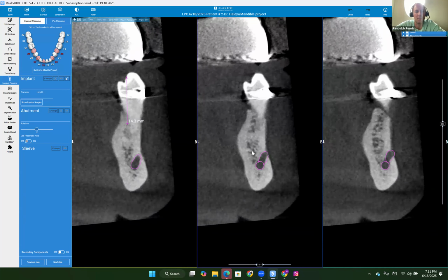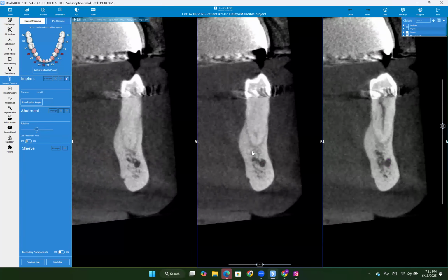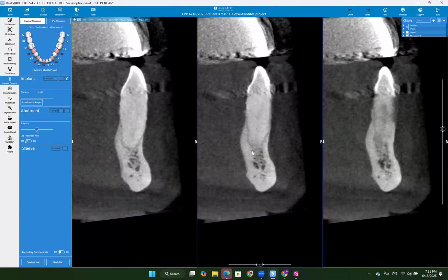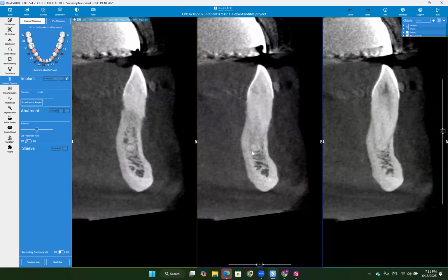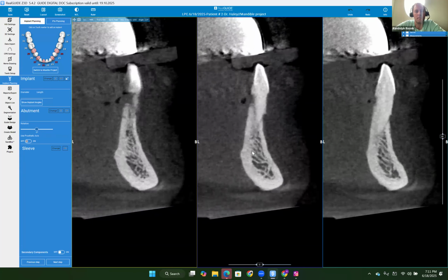And the bone graft looks like it's filling in well there at 19 and 20. You said that was done about a month or two ago? Yeah, the CBCT is probably a month old, and so the graft has only been in there about a month in the CBCT.